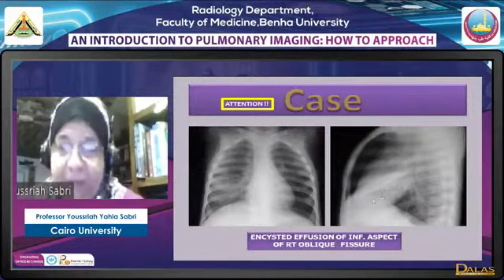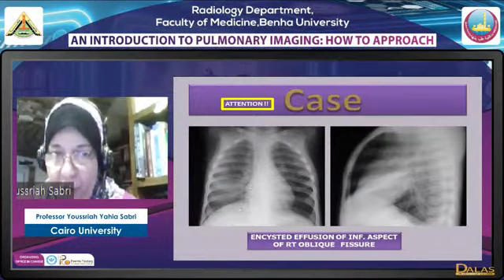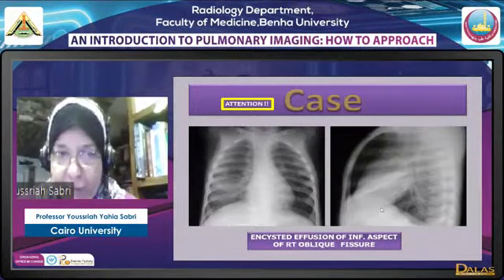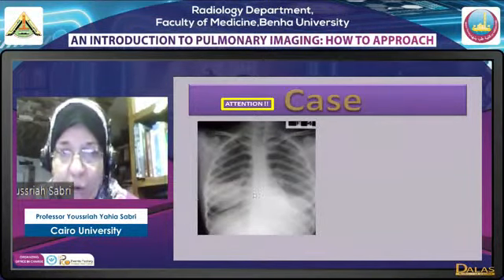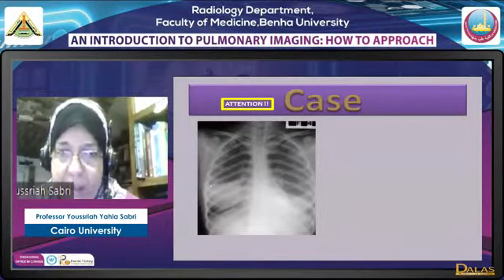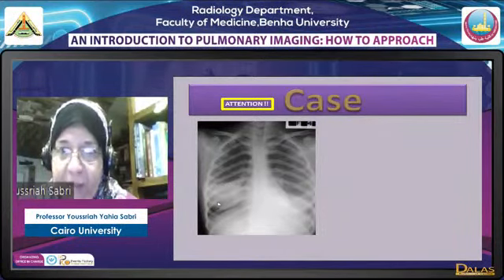So we have the previous lesion, we have a concavity, which means we were dealing with obscuring of the heart, meaning a middle lobe lesion which is collapsed. Here we have no obscuring of the heart border and biconvexity in the lateral, meaning we have a loculated effusion. In this case, we have now obscuring of the cardiac border. We have the linear definition of the opacity, meaning this is the minor fissure here, okay, and this basal opacity obscures the heart and is delineated superiorly by the minor fissure.